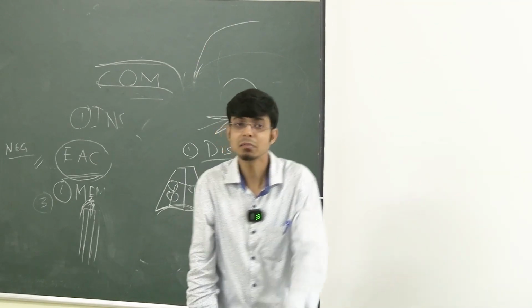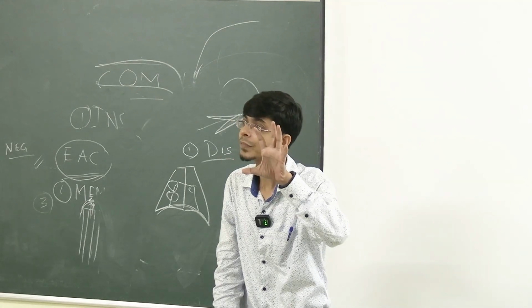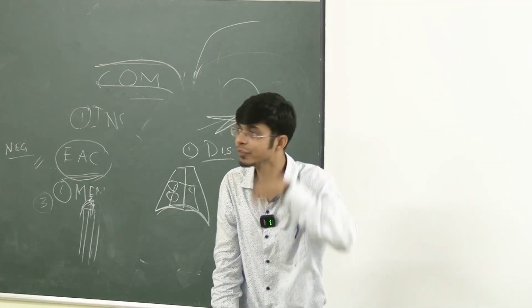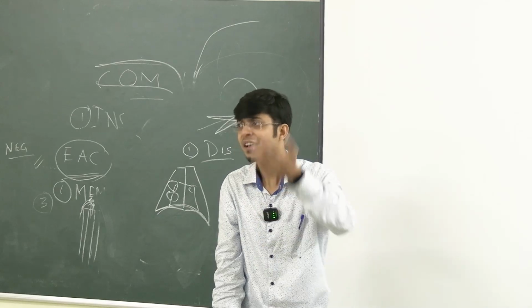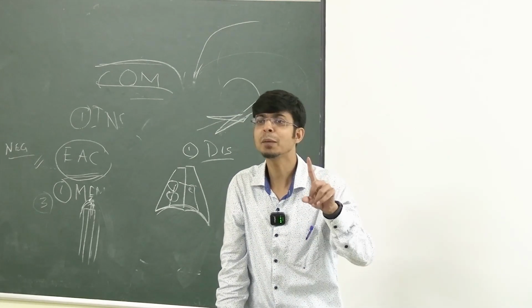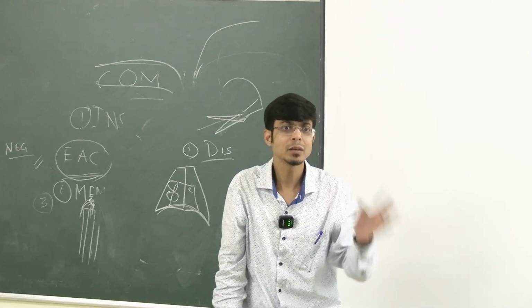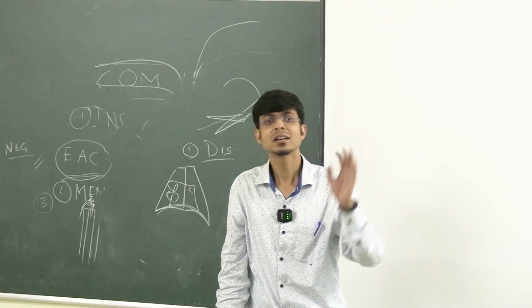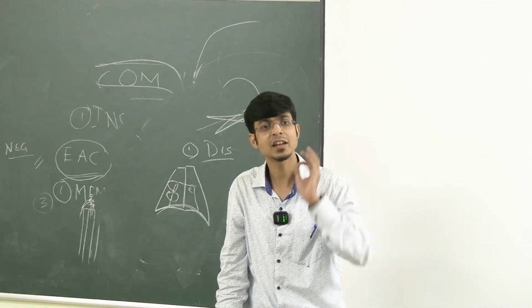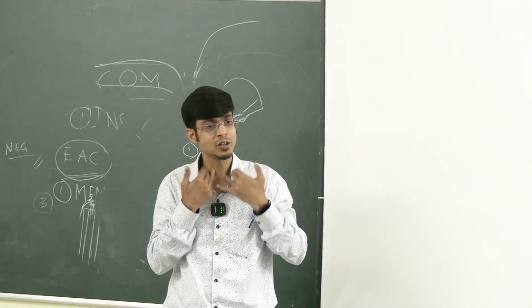তাহলে কি হবে symptom ভাব? There is some soft tissue in the nasopharynx, so it's blocking the choana. নাক থেকে হাওয়া যাচ্ছে না, the air is not going along its normal passage, so the adenoid is obstructing the airway. So what will happen? The sinuses won't be able to drain properly because the airflow is restricted. The patient will have sinusitis, continuous nasal discharge, because the discharge that normally comes off the sinuses goes through the nasopharynx into the throat.